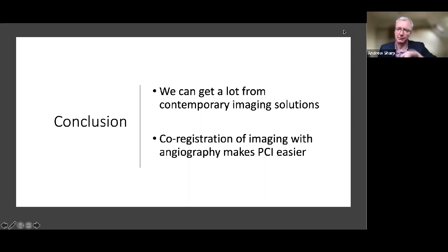Sometimes you can't do that. If you take a big 5.5 in the left main and you hang it out into the LAD, you're risking rupture at the bifurcation of the proximal LAD. Here we saw that there was positive remodeling at the proximal LAD, so we were okay. As long as your balloon is below the media-to-media diameter of the artery at any given point, you're very unlikely to rupture.